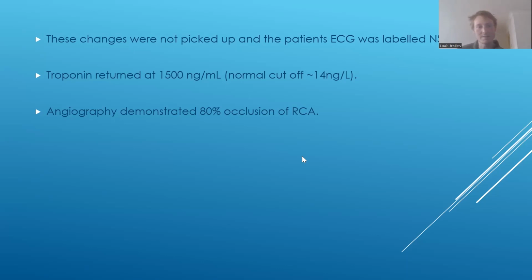So right coronary artery, remember we have our heart. That's probably a bad color to use here. We have our heart. Oh my God, that is a bad drawing of our heart. But the RCA comes down and it supplies the right ventricle with blood, and the right ventricle is best observed in the ECG by our inferior leads, and V1, V2 kind of looks at the top of it as well. Okay, so this finding here supports that concern that we had for inferior infarction in our patient.